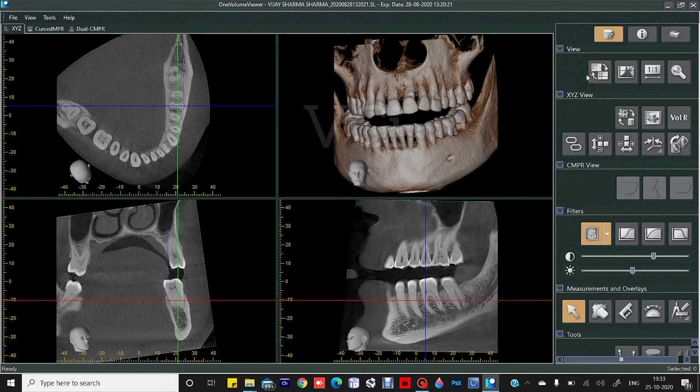So coming to this, just to know about the software, what you basically have to do, just drag the mouse without clicking any buttons of the mouse. Just take your mouse to the buttons. It will automatically show or hide the positioning cursors, then view the histogram window, see images in 1:1 ratio or magnifying. So let's talk about each button in a detailed manner.